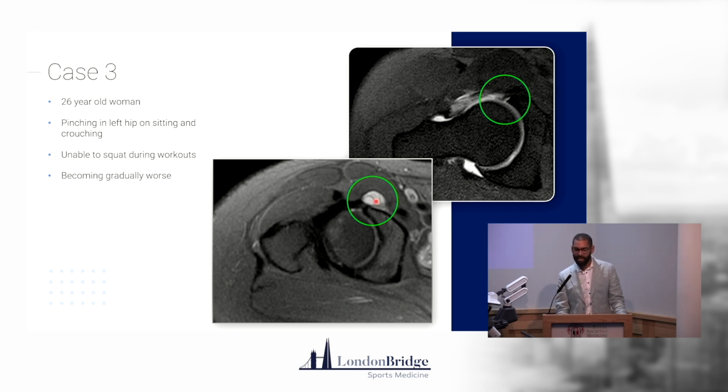So that's something that, again, you want to diagnose, you want to drain, or at least attempt to drain, and try and calm down from that point of view, with the proper rehab. You can see those on ultrasound, with the eagle-eyed viewers, but I think an MRI is definitely going to be the first choice investigation.